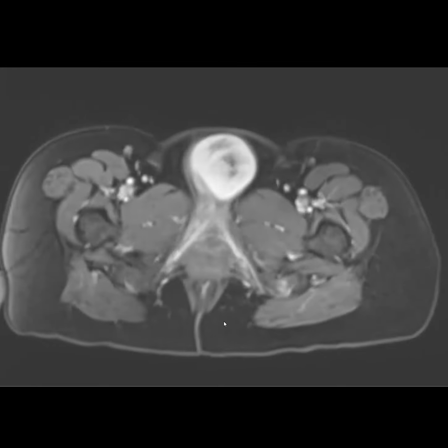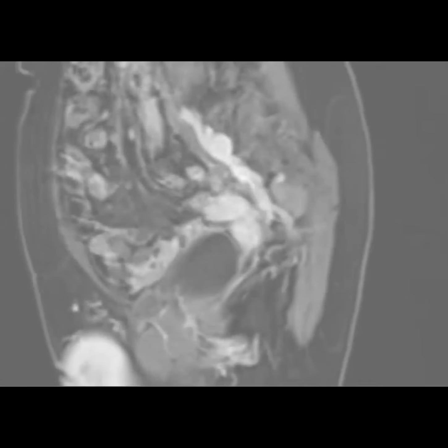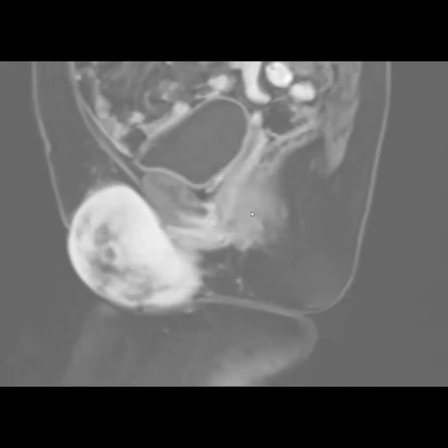I would put sarcoma, like a stromal kind of tumor, in there. It doesn't have normal, or rather benign-appearing, T2 signal, so I wouldn't put benign. I guess it could be a leiomyoma kind of thing, but it doesn't look dark like one. Yeah, excellent. So this was a sarcoma. It was actually a low-grade spindle cell sarcoma.